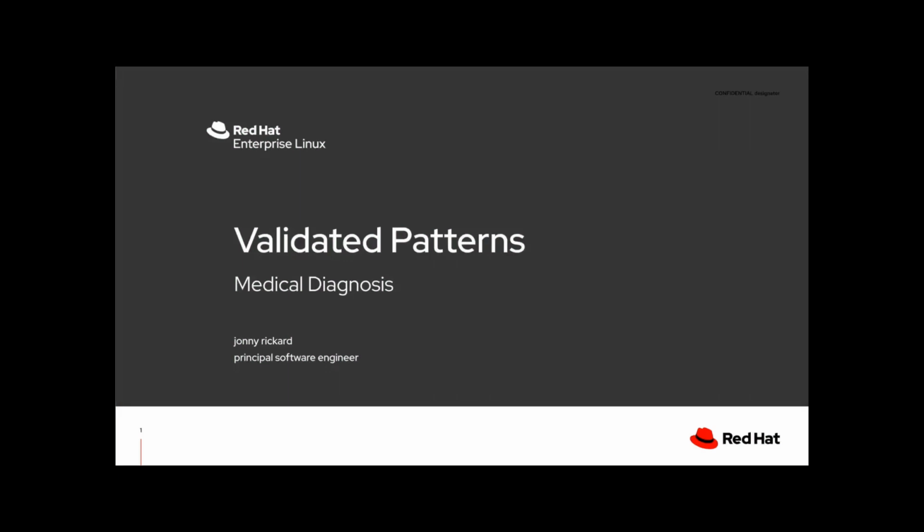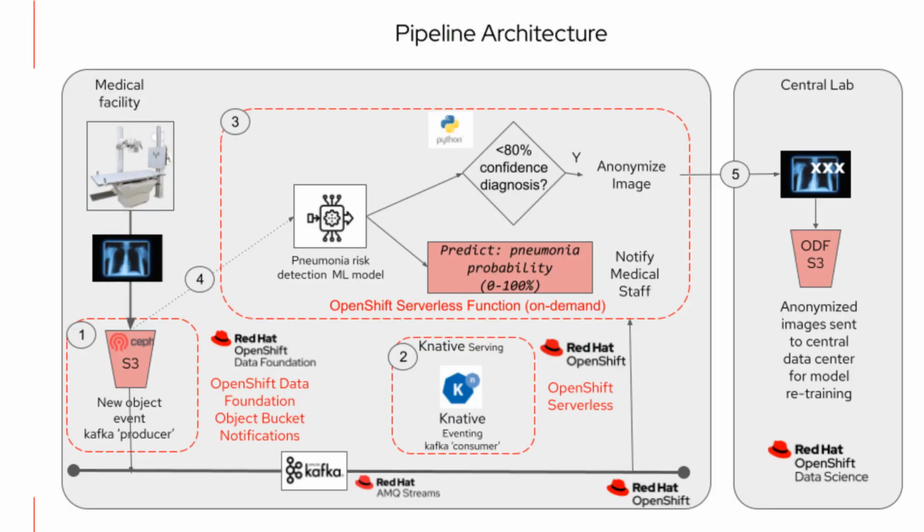Hello! In this video, I'm going to demo the medical diagnosis validated pattern. The medical diagnosis pattern is more than just the identification and detection of pneumonia in X-ray images.